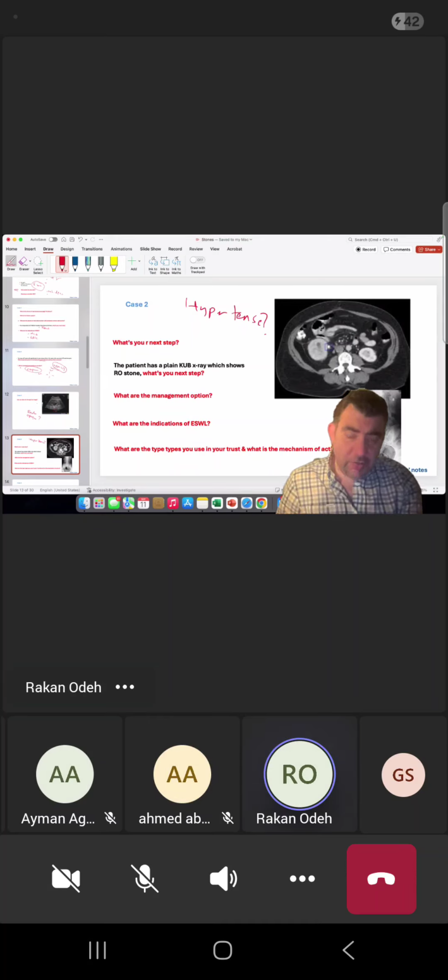Okay, so is this CT with contrast or with no contrast? No, this is CT without contrast. Looks like contrast, kind of. Yes, with contrast, correct. Okay, fine. So what about the other film here? So I would like to see the coronal film and assess the other kidney.